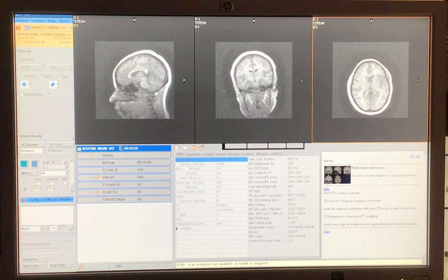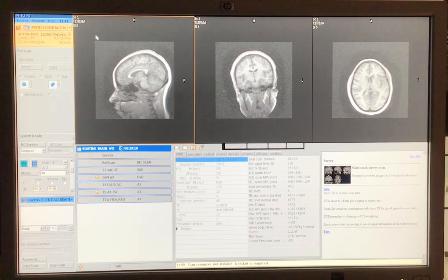And I don't have to have sagittals and coronals and axials here. I could put my coronal here, I could put my sagittal here and my axial, or I can put my axial here and my sagittal here and my coronal here. It doesn't matter how you have these, but what I suggest is, because you have 3 planes here, that you have one plane of a sagittal, one other plane of a coronal, and another plane of an axial, okay?